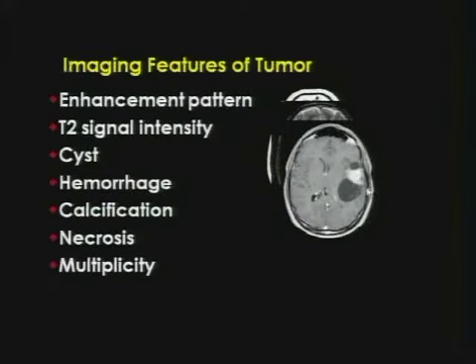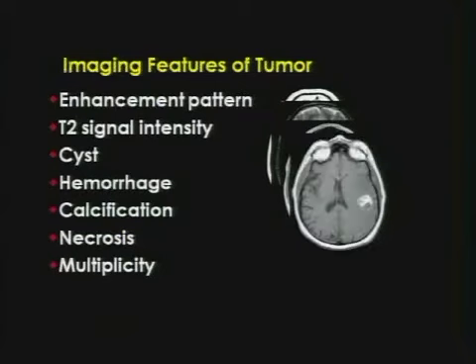When you see an imaging characteristic that has a combination of a cyst and a nodule with very minimal surrounding edema, there are only really 3 or 4 things that should run through your mind, pilocytic astrocytoma being the most common. A ganglioglioma, pleomorphic xanthoastrocytoma, and if this was in the posterior fossa, I would also put in hemangioblastoma. Non-contrast T1 weighted imaging showing you a bright T1 mass. This is a hemorrhagic metastasis, but this could be a lipid-containing mass.